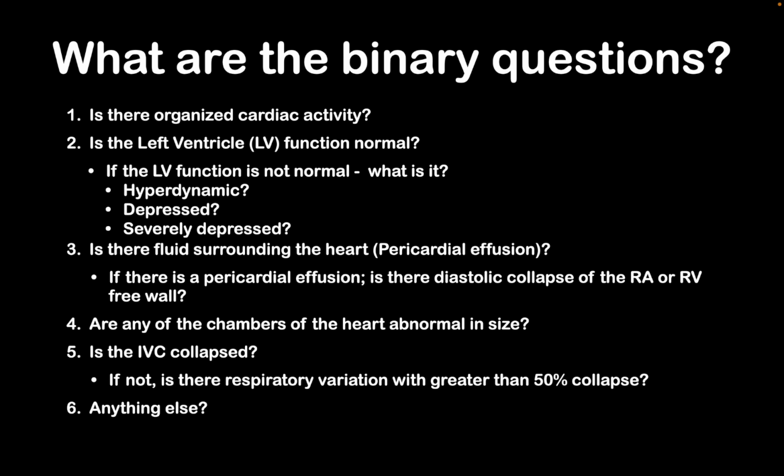So we're going to go ahead and work through these questions. Again, if you wanted to try answering these questions, you can go to the other video and fill it out. But I'm going to start working through each one of these binary questions with you. What we're going to find out is, yes, there's cardiac activity. We can clearly see that. No, the left ventricular function is not normal.